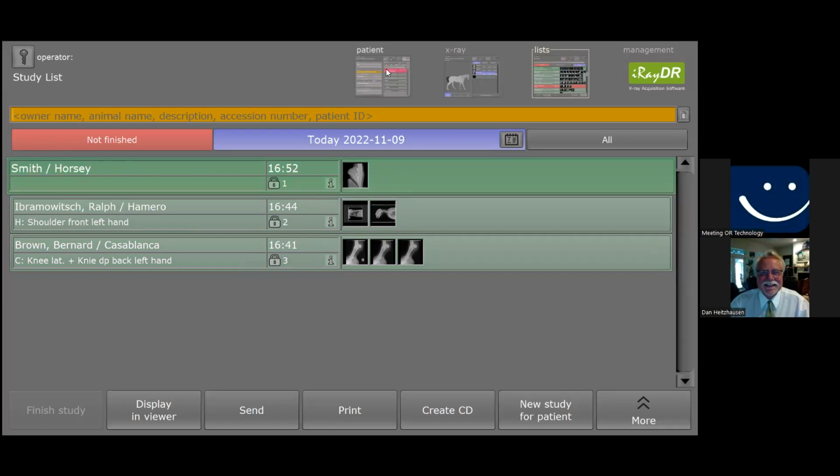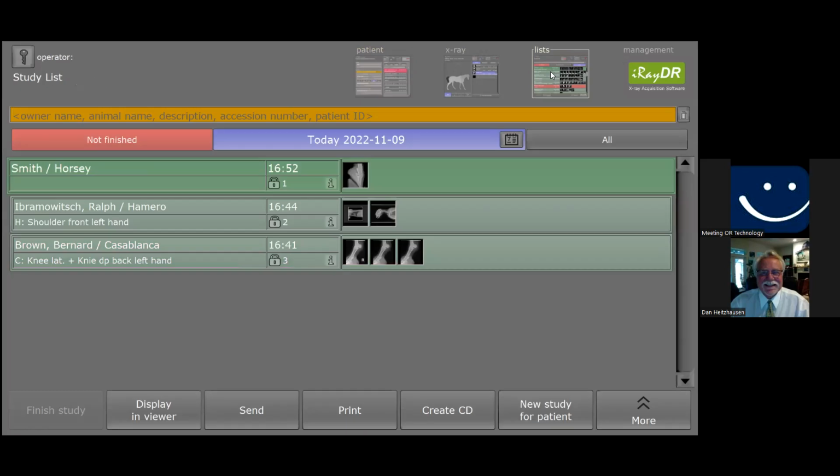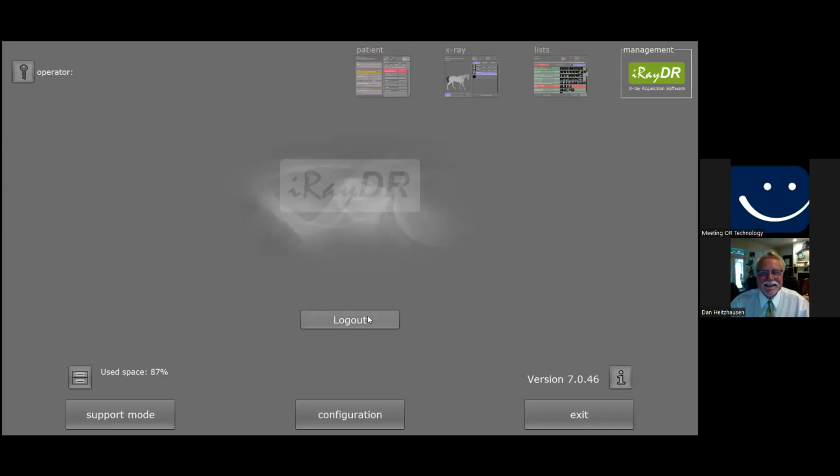Okay. Yeah, I think that's about it. I hope the basic workflow is clear enough. I think it's quite straightforward. You create a patient either manually or from your network, and then you take an image, you plan an image, you expose it, and it gets finished, and you have it in the list view back here. All right, I think that's it for me.